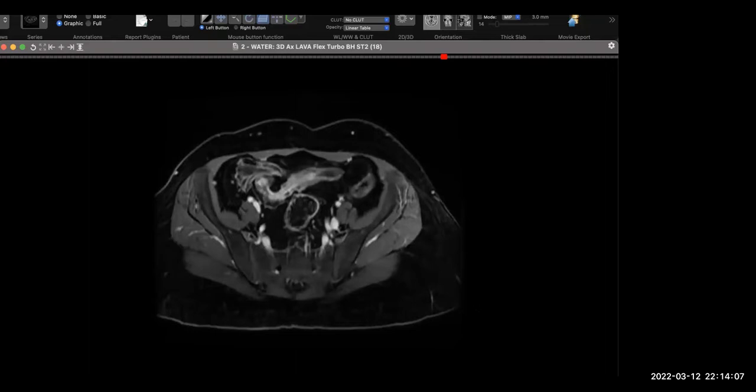So to put all my findings together, this is a case with chronic Crohn's disease. And if the patient is presented acutely, I would have to look for any ulceration or fistulation, which has caused the acute bout of pain. Fine.